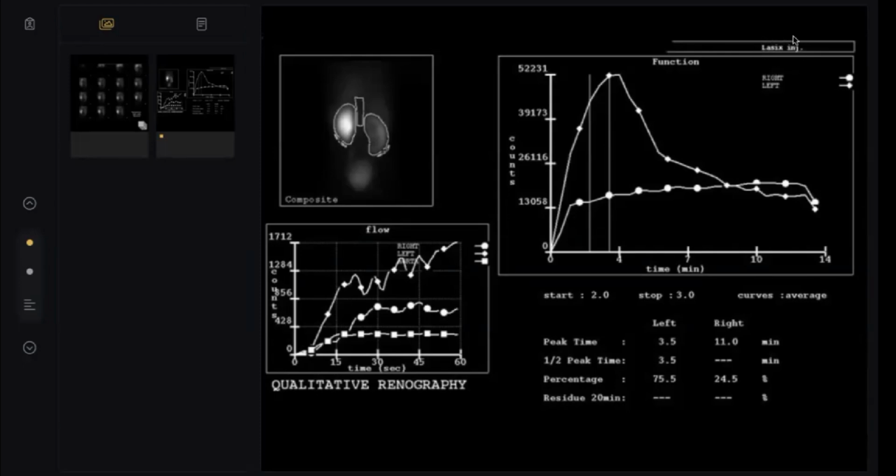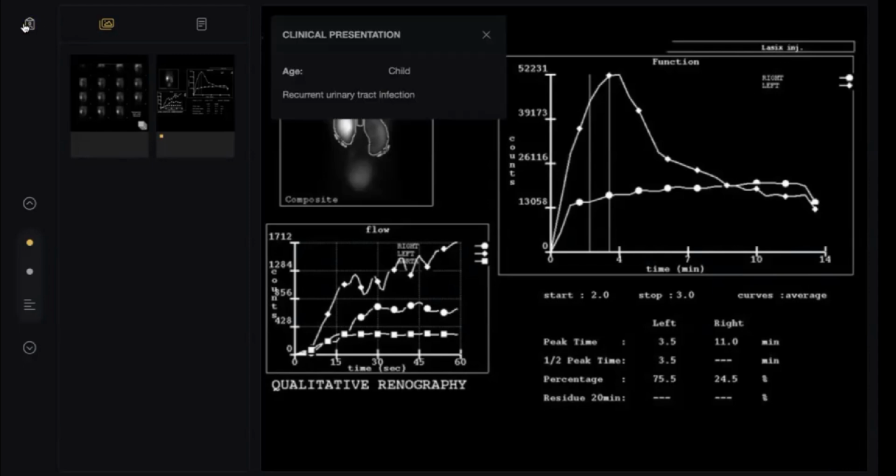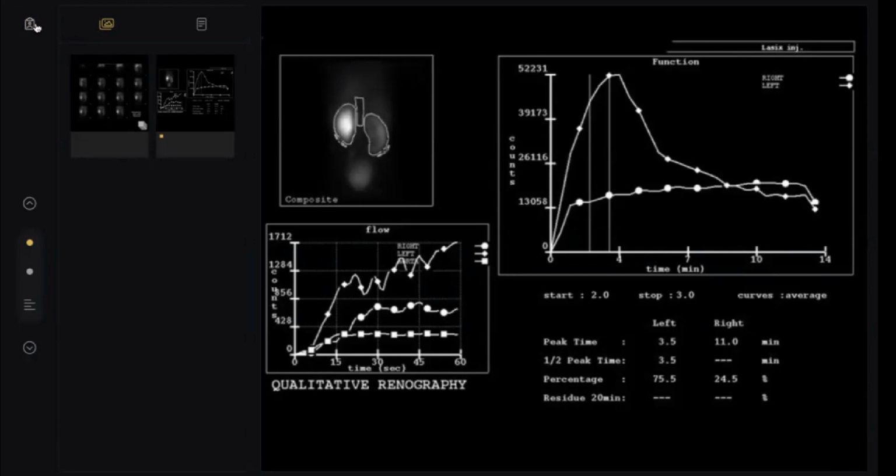What I mean by this: if you see a renal scan MAG3 with Lasix, put in your mind that the diagnosis must be obstruction, especially if the patient is young, almost certainly PUJ obstruction. If you see an adult renal MAG3 with captopril, 90% the case will be renal artery stenosis. Don't confuse yourself. I think it is very easy.